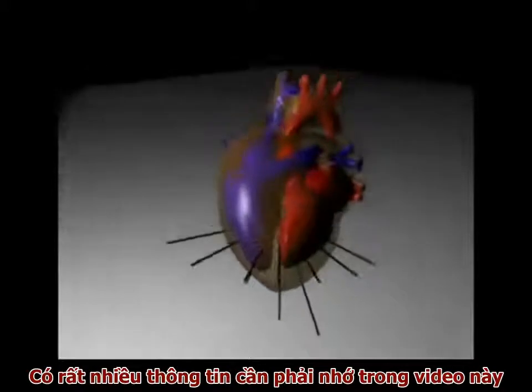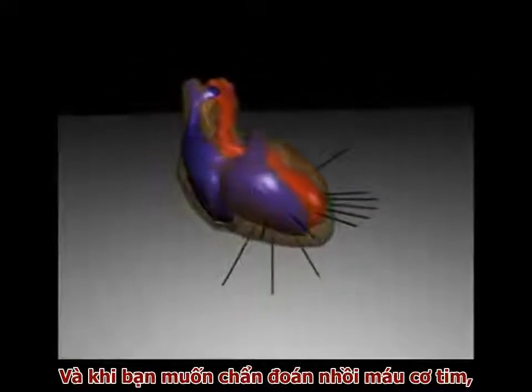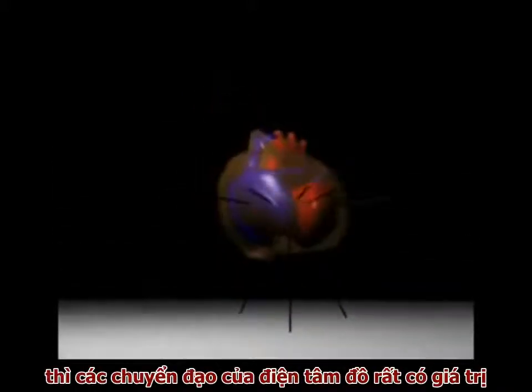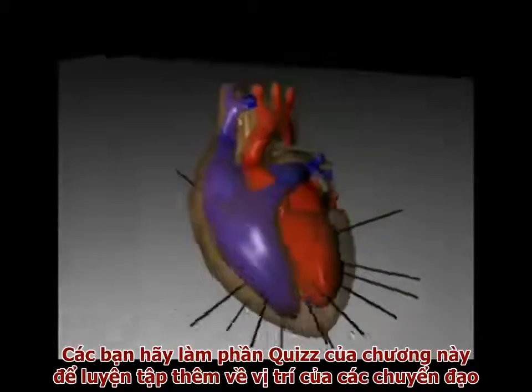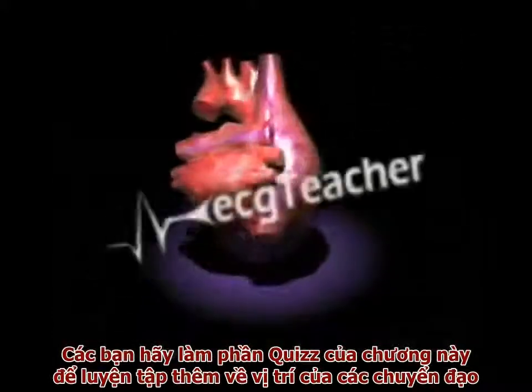There is a lot to try and remember in this video, but as you'll see when we go on to diagnose heart attacks and serious pathology, the perspective of the individual leads on cardiac electrical activity is well worth knowing. We will try and reinforce your knowledge of lead positions in the test material at the end of this section.